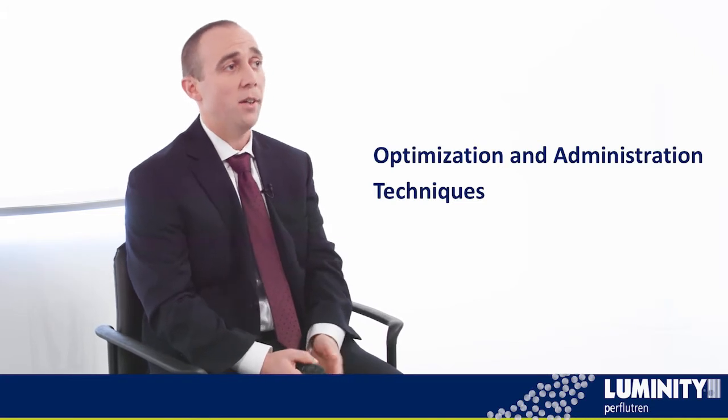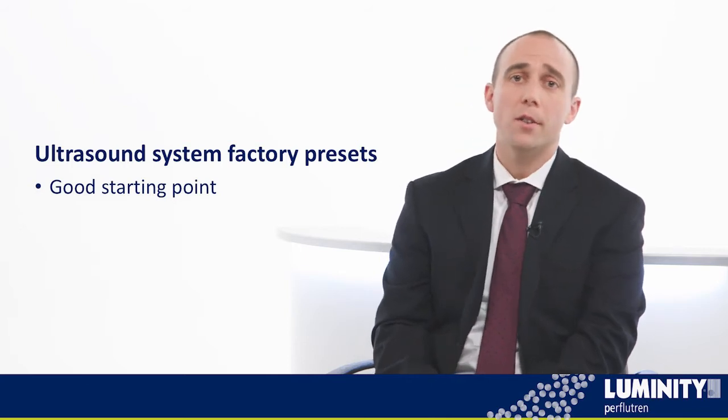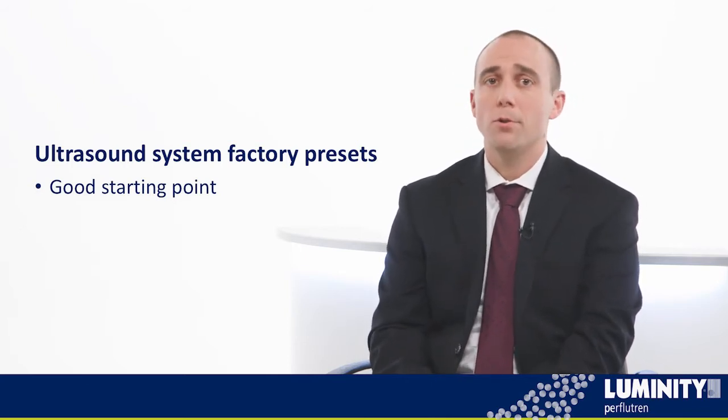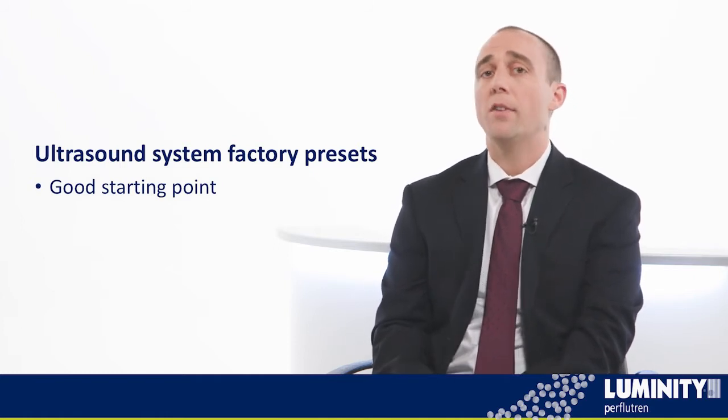Okay, so now let's discuss optimization and administration techniques. Ultrasound systems have factory presets and recommended settings for contrast, which serve as a good starting point. And although these are typically a good starting point, some controls do require additional adjustments for each patient to achieve optimal results. Right? You wouldn't do an entire unenhanced echo without changing some of the settings. This is no different when using Luminity.